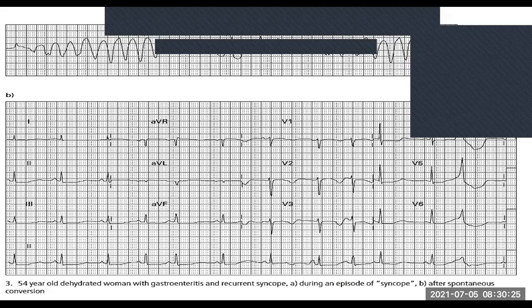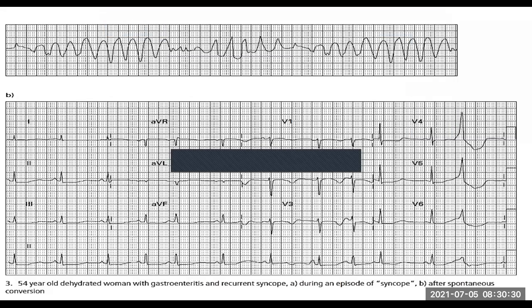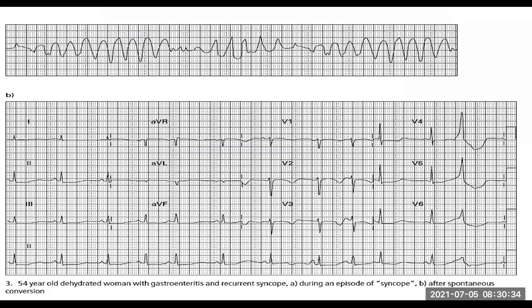Let's look at the rhythm. How do we look at rhythm? We've got a nice long rhythm strip over here. The first thing you normally have to analyze in rhythm is your P waves. Let's have a look at all the P waves. We've got a P wave there, a P wave there. Do they look normal?